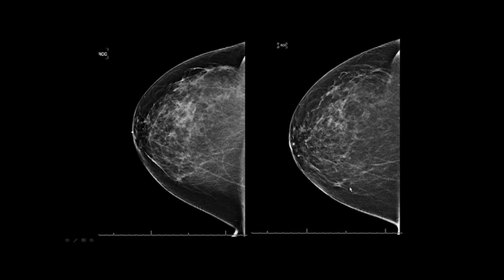The contrast is better. This stands out better. This, in fact, looks a little blurry, maybe. You can see this isn't well separated compared to this. And there might even be something here medially. We don't know. You can see there's a calcification here. You can't tell there as well. So you can see the extreme difference from very good compression to just not adequate compression.